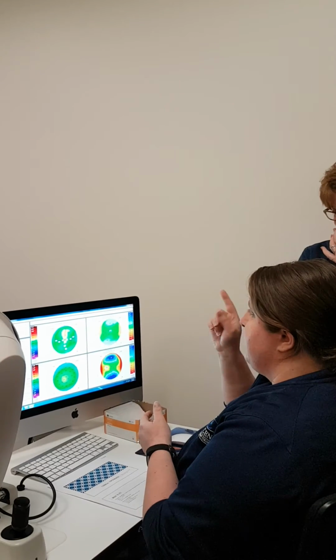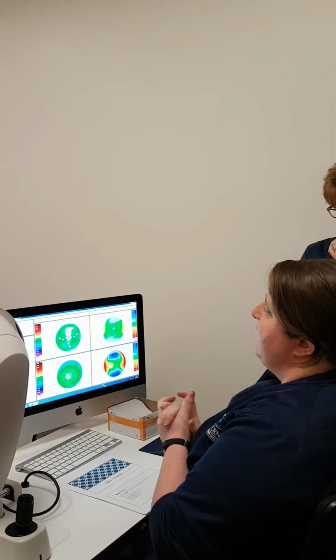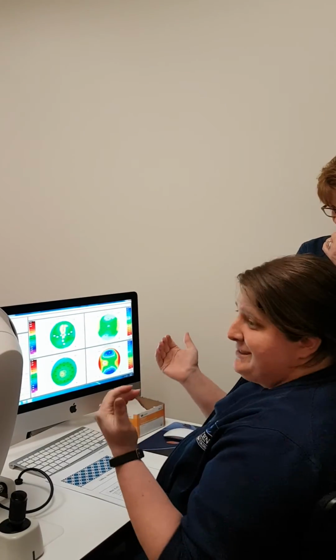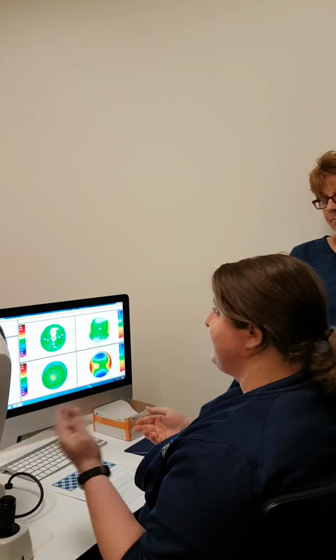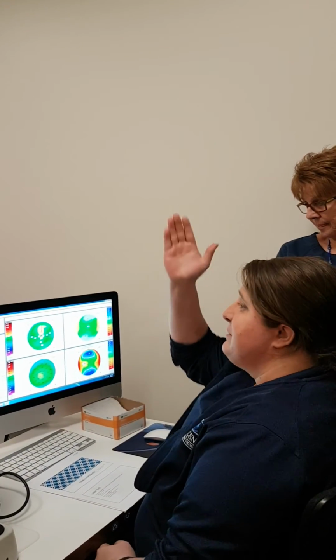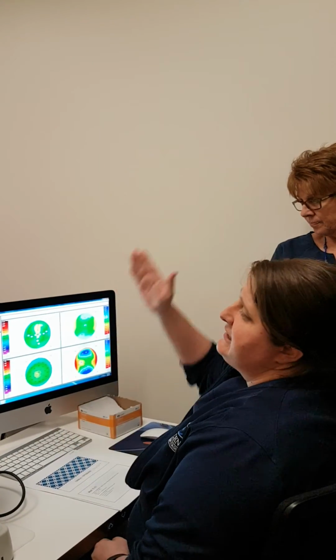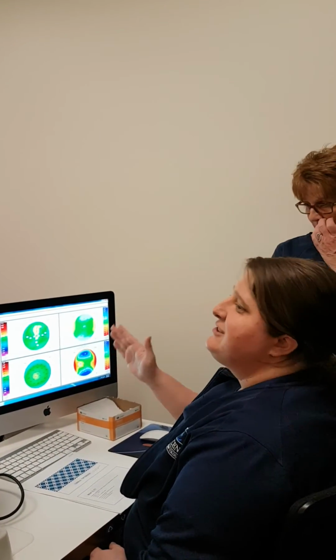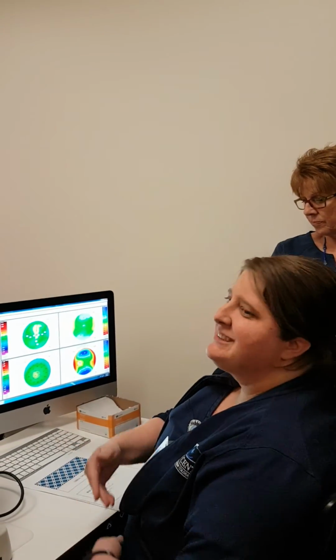There is one other thing that I wanted to show on this. Dr. Mayer has been using a change analysis, basically. They have one for posterior OCTs, those kinds of things. They also have one for the Pentacam. It lets us compare, okay, these were our last time numbers, these are our current, what's the difference? So it's really helpful for keratoconus patients.